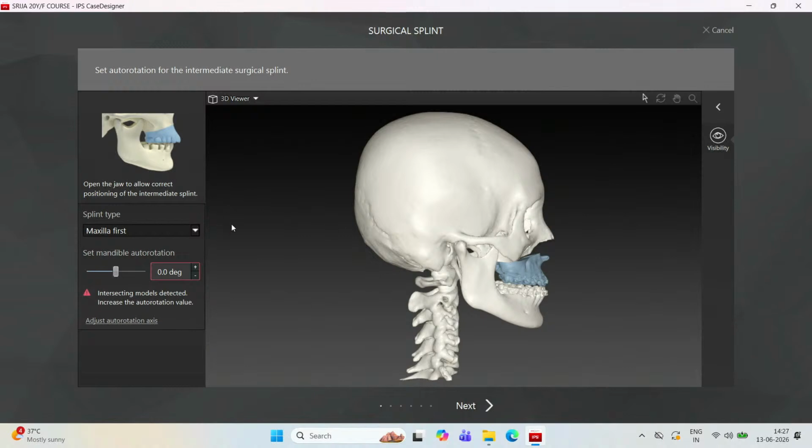For people who might have another doubt: you have planned it along with maxilla and mandible, you like the profile with 8 mm of maxilla and whatever the occlusion based mandibular movement. Now on table you decide that you want to do the mandible first for some reason. You did the planning, but you want to operate on mandible first.